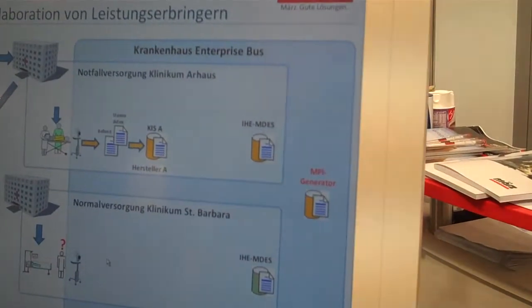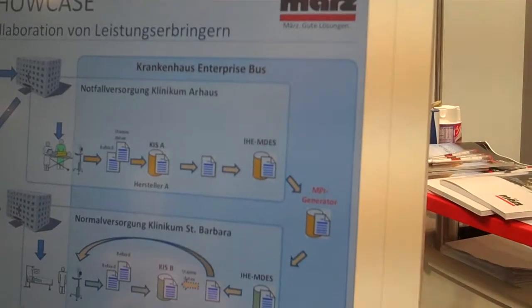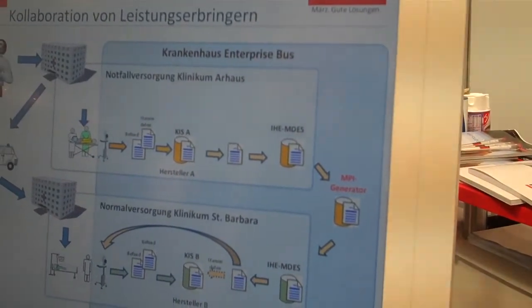We search on Dominic Haas again. You can see a brand new report comes up. This is in a new domain at St. Barbara Hospital. So we're down there, and we've proceeded to where we want to look up the reports.